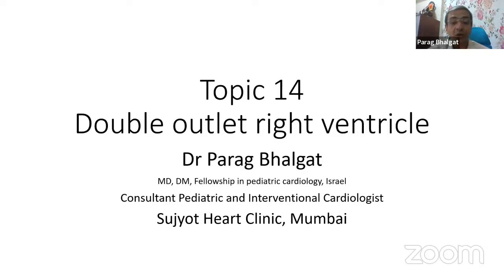I request you to observe this lecture in a dim light so you can see the sonography images, the 2D echo images, better.